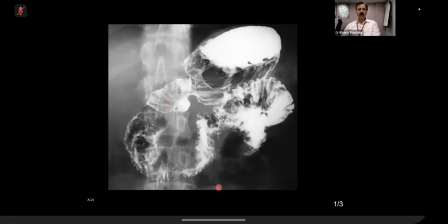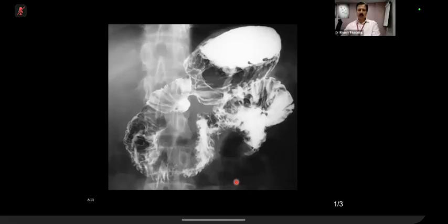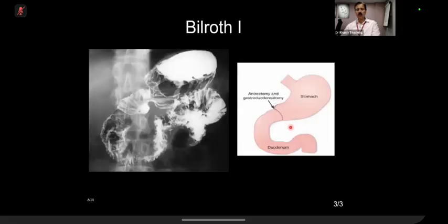And hint, it is again post-surgical. The antrum looks a little bit smaller, perhaps reduced, I guess. So which kind of surgery has been performed? Antrectomy? Excellent. And this is known as, if you see another view here, this is known as Billroth 1.